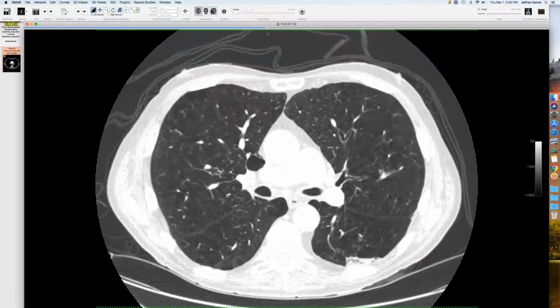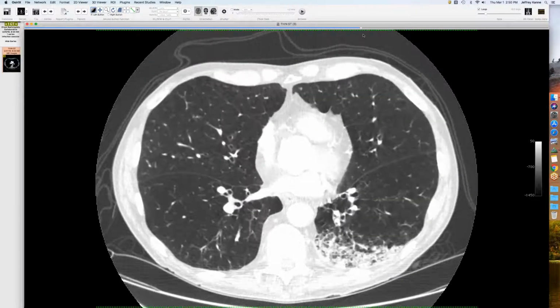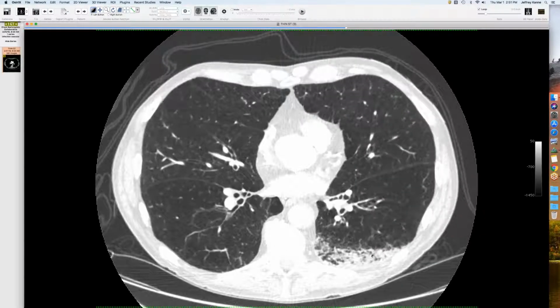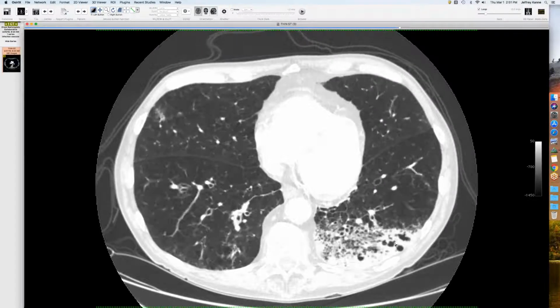It was not just a little bit of blood tinted sputum, but he'd cough up a tablespoon or two every so often. You can see there's debris in the airway, and pooling in the left lower lobe is all this consolidation. What's kind of interesting is it almost makes a fluid level. So maybe a lot of secretions and pus filling emphysematous spaces, debris in the airways.